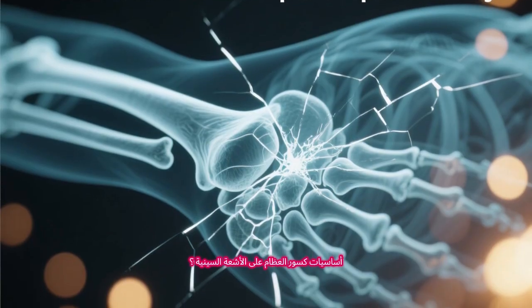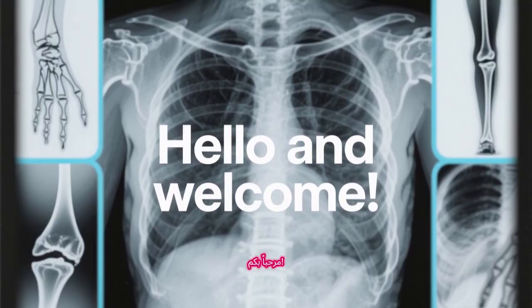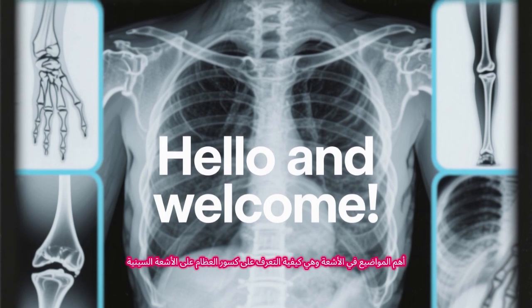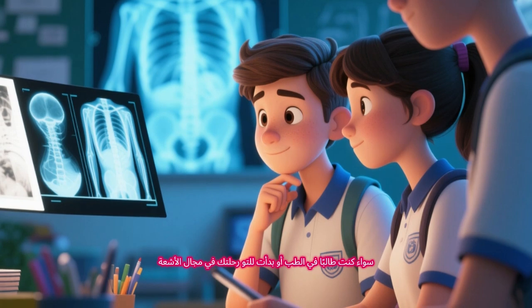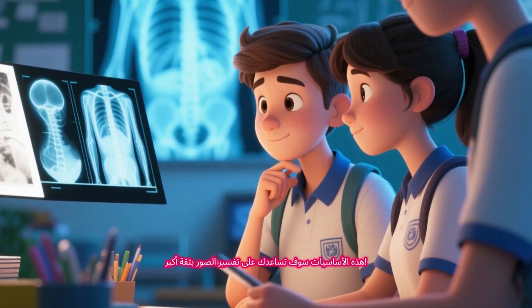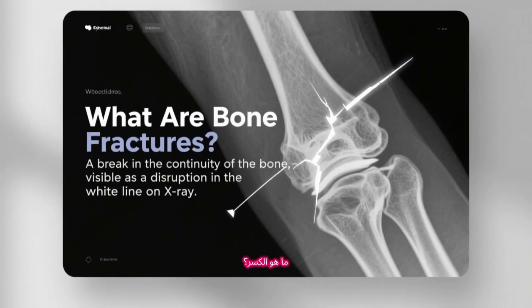Bone fractures on X-ray, the basics. Hello and welcome. Today we will take a closer look at one of the most important topics in radiology: how to identify bone fractures on X-rays. Whether you're a medical student or just starting your radiology journey, these basics will help you interpret images with more confidence. What is a fracture?